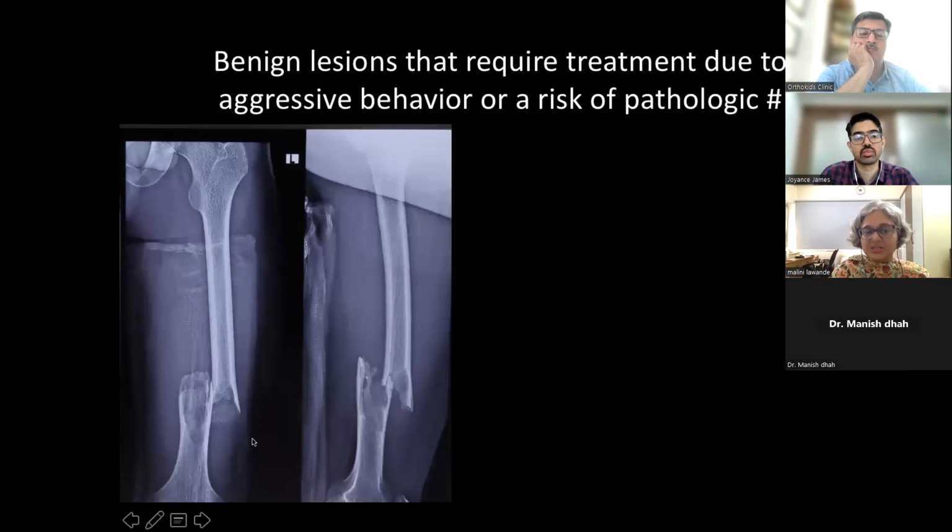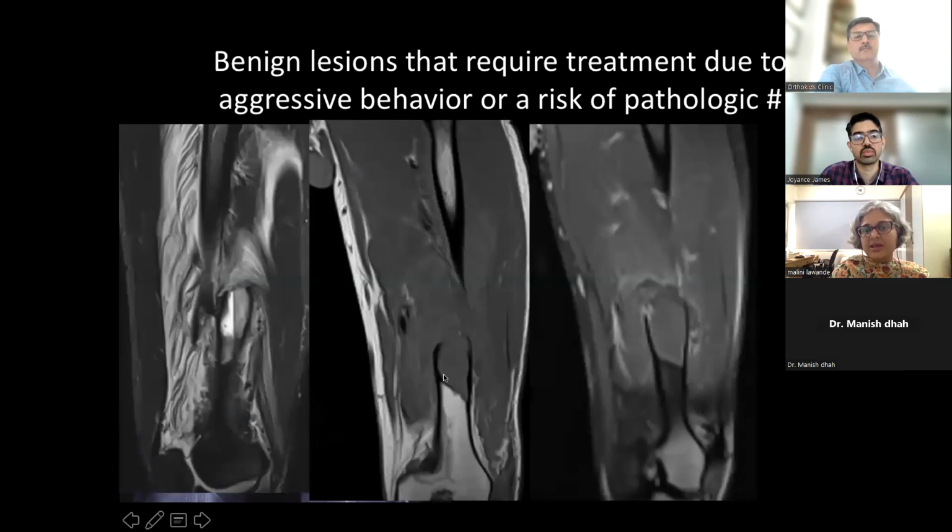This patient with a large pathologic fracture, again, you know it's a well-defined lesion. MR confirms there's a blood fluid level, it's a cystic lesion, and see the contrast enhanced. It is only peripherally enhanced. So this is a simple bone cyst which had a fracture.